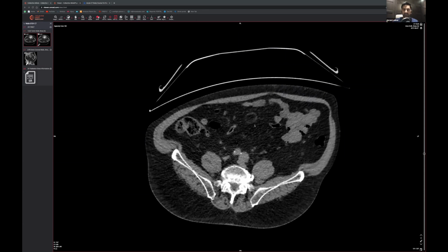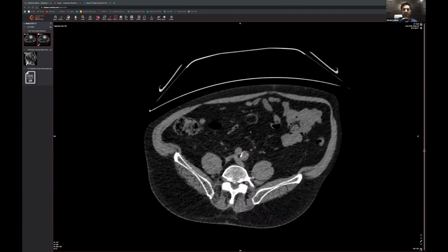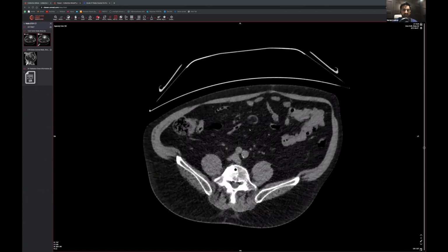And examiners and all those kind of people, they love this kind of case because it's an atypical presentation of a very typical finding. This is epiploic appendicitis, no doubt about it. It's just slightly unusual in that it's so high up in the abdomen. But this can happen a lot where someone comes in with query renal calculi and all that kind of thing, and ends up having appendicitis, diverticulitis, or epiploic appendicitis.